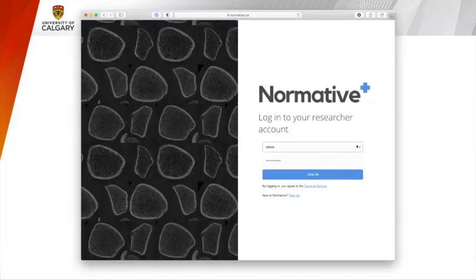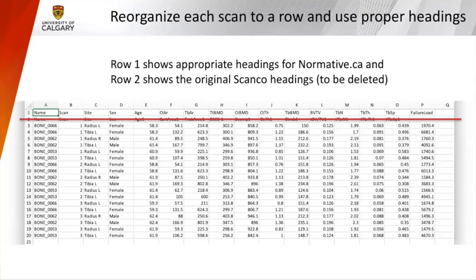I'm actually going to show you the way to convert that. Sorry, go back that slide, the way to convert it into this format. I did it manually. I just did it carefully using Excel, and I moved all the files around. Ultimately, it has to be saved as a comma separated file, CSV file, and you can do that with Excel. And if you do that, this is what it would look like if it's not in an Excel file.